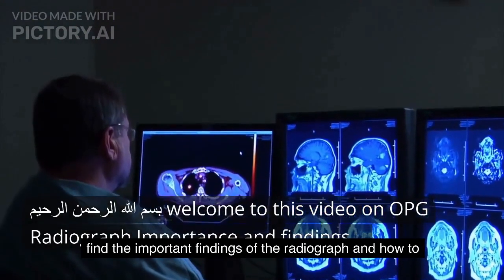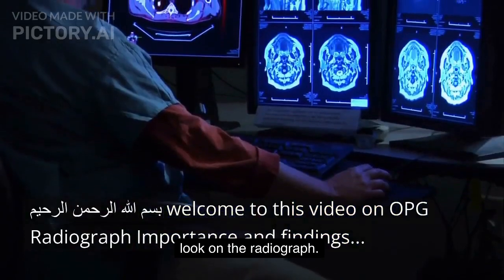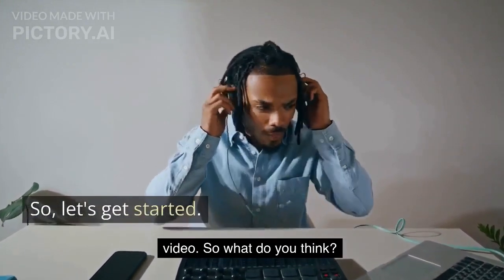Welcome guys with another video, and today in this video we will be talking about how to analyze and how to find the important findings of an OPG radiograph and how to look at an OPG radiograph. So without wasting any more time, let's move on to the video.